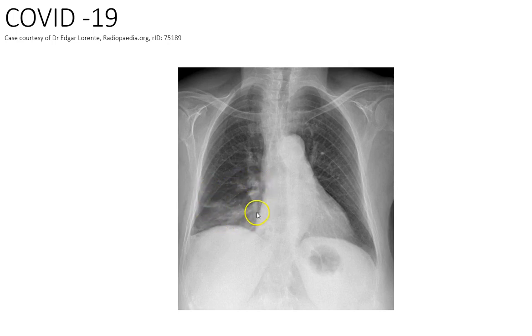So my treatment, I wouldn't treat them if they were unproductive, but if they were productive, I would focus my treatment on the right upper middle, the top of the right lower lobe or the middle lobe. That would be where I'd focus my treatment, if they were productive. Of course, if they were unproductive and they were mobile, then we wouldn't be doing anything for them with physiotherapy.